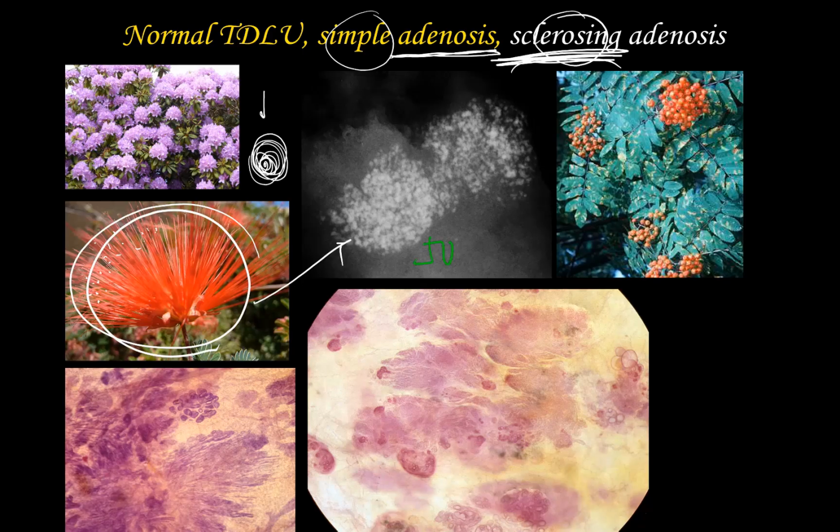Because in 50% of the cases, it's benign hyperplastic breast change. But in 50% of the cases, grade 1 cancer in situ looks exactly the same. And neither you nor me will ever be able to distinguish, because both of them have the very same onion ring-like calcification. Big problem in everyday practice.